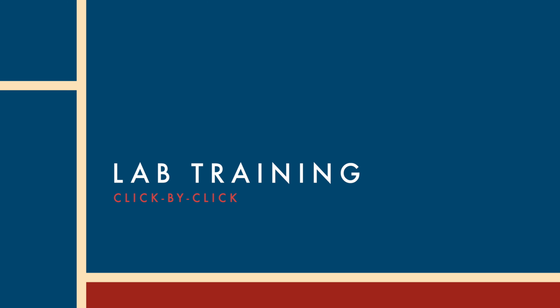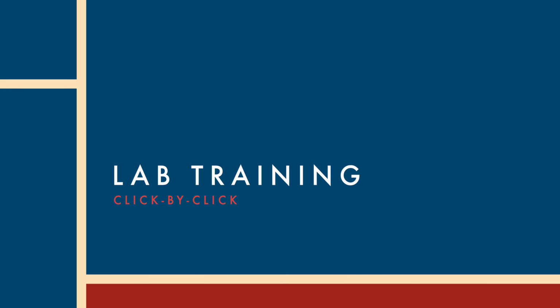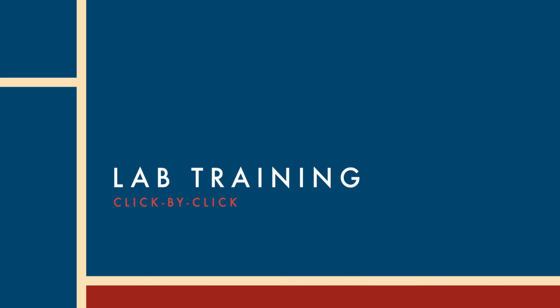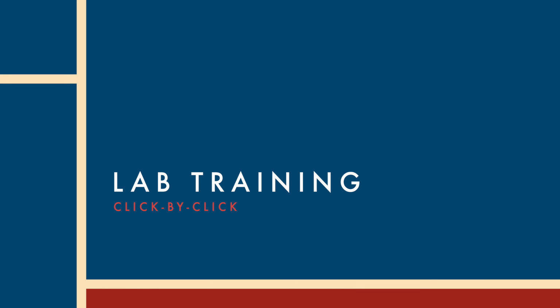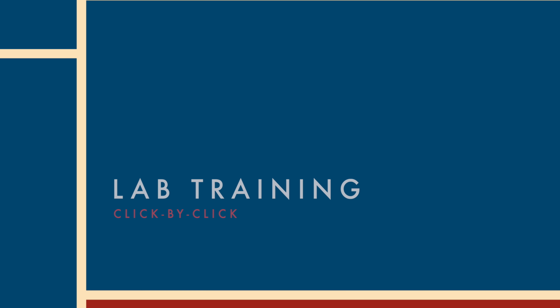This is our click-by-click lab training. It covers taking all of our data components, that being the pre-op intraoral scans, the post-op intraoral scans, and of course the ICam implant positions, and aligning them all within the Imetric iScan software so that they can be directly exported to Exocad and give you a very strong foundation for your restoration design and creation.